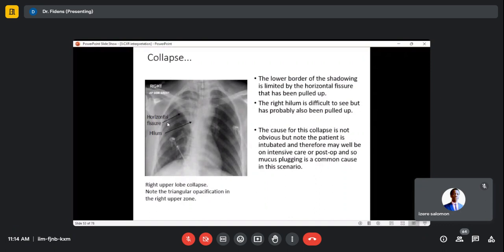The patient has a risk that the endotracheal tube can go into one bronchus, and most likely it will be in the right main bronchus because it's the one that's more vertical. Is it clear? Clear. Yeah.